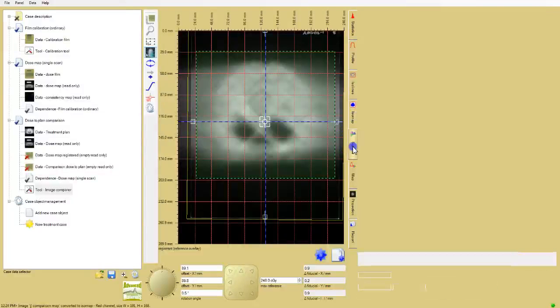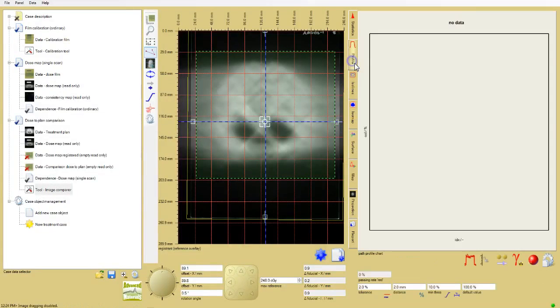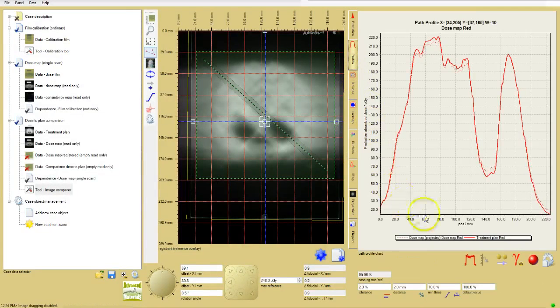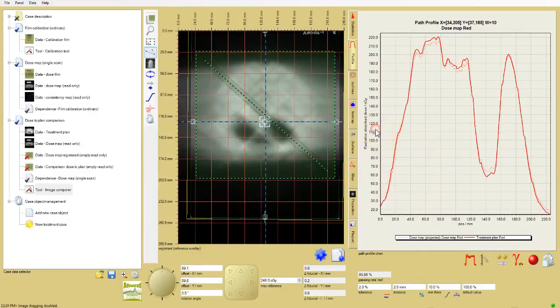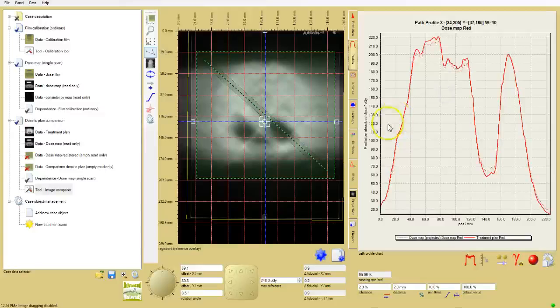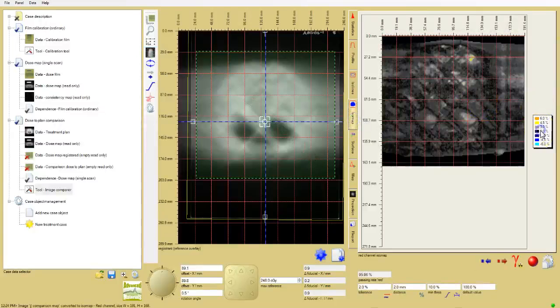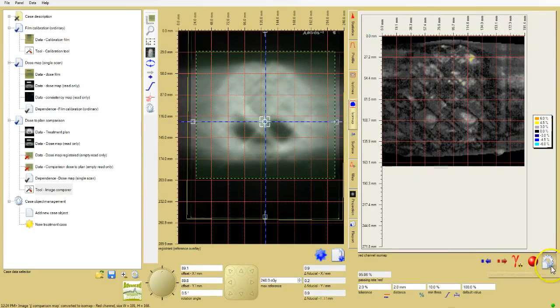Many of the display parameters, for example, axis ranges, line widths, display colors, etc., are automated or set by default. But if you right-click in the display or near the axis or on a chart legend, the settings can all be customized. If you want the customized display to be added to a report, be sure to update the record by clicking the icon at the far right under the display so the custom settings are used in the report.